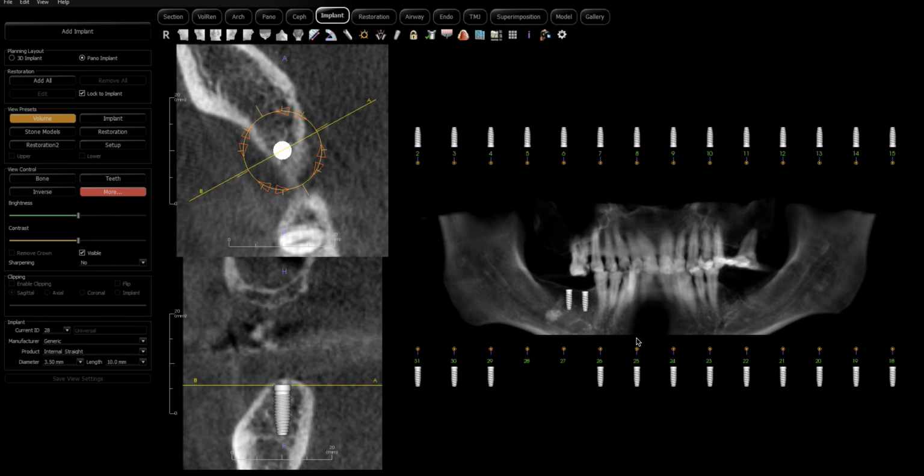Reason I would maybe consider splinting here is because of the fact that the patient lost their lower teeth. When you see a presentation like this, you have to ask yourself the question, how did the patient lose those teeth? Parafunction would be my guess. Parafunction combined with poor oral hygiene and a high caries risk. With that said, all of his teeth had the same hygiene risk profile. All of the teeth had the same cariogenic profile, yet only the posterior lower teeth suffered a demise. I can't say for sure, but I think it's the parafunction in those areas that's important.